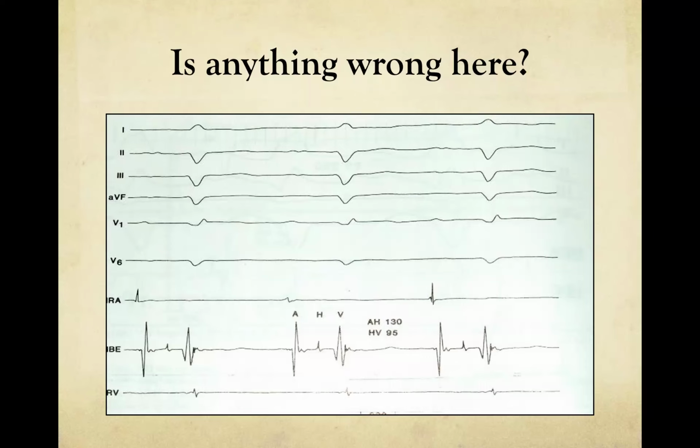I don't see a His cap, or I guess the second one from the bottom is a His. It says HBE, which stands for His bundle electrogram. Got it. Sorry, it's cut off. No worries.